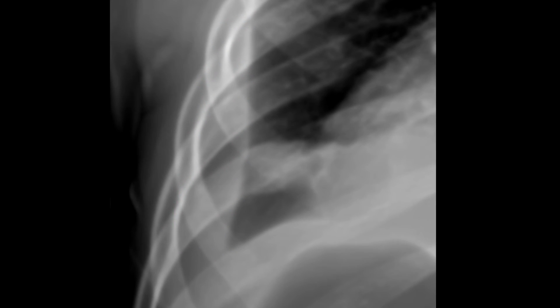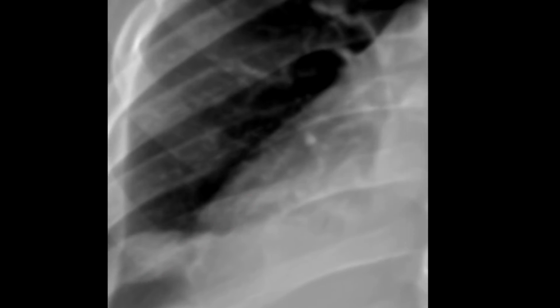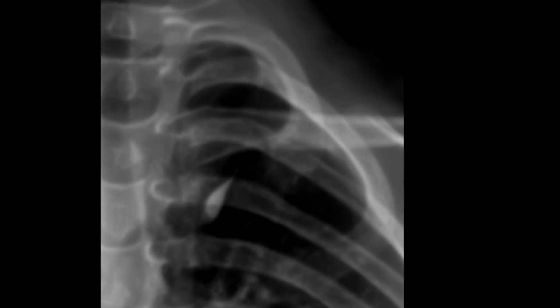And as we compare the ribs and look for symmetry, there is a small little bump seen at the inferior aspect of this rib, a small little density that's not really seen at any of the other ribs. Incidentally noted in the right upper lung field is an azygous lobe and fissure, but not of any clinical significance, but of note.